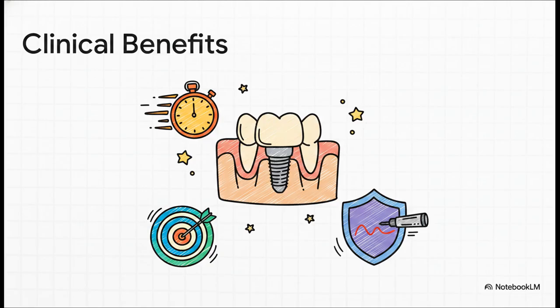Oh, and these 3D printed guides, which by the way equal or even exceed milled guide accuracy, they're compatible with virtually all modern implant systems like Nobel, Straumann, Zimmer, and Dentsply. Ultimately, utilizing a workflow like this just massively enhances a dental practice's credibility, and more importantly, the patient's trust.